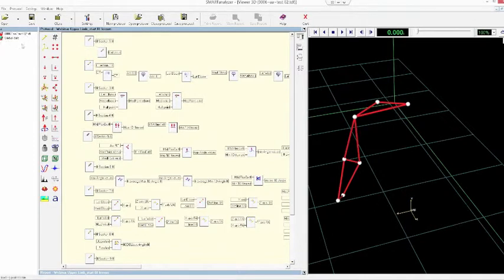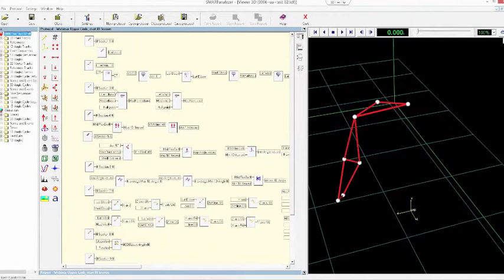And the data panel on the left contains the TDF file containing all the tracked trajectories and all the variables that we have computed with the protocol blocks that we have applied to the trials. The global data folder contains the computed average variables in case we apply more than one trial to the protocol. Well, let's now start to learn how to create a new report.